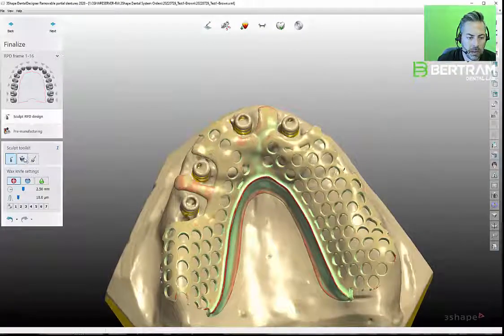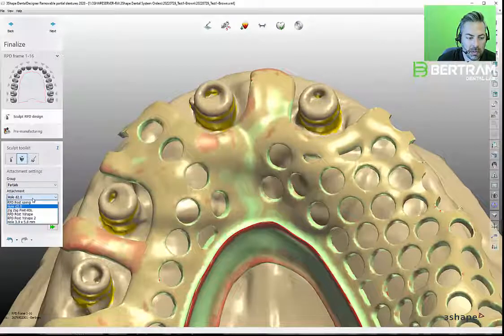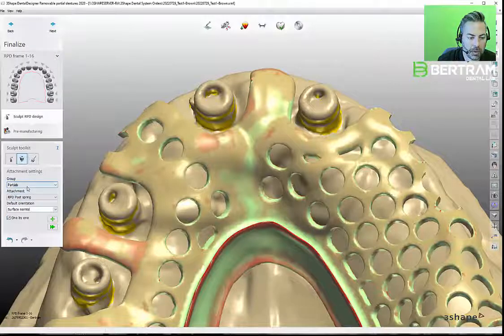Now I'm going to punch a couple of holes to blend it where we seam this together. I'm going to go to the partials group, at least in our library, and go to the RPD. This is a 2mm hole. For me, it's much easier to use view direction when applying these. Hit plus.